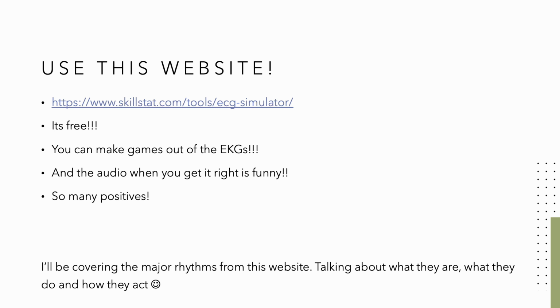So today we are going to be using this website called ECG Simulator by Skillstat. It is a completely free website that you can create games out of the common EKG rhythms. Who doesn't want to fill their free time with EKG games? Just kidding, we don't have much free time in medical school. But this website is a great tool to use, as well as Life in the Fast Lane.